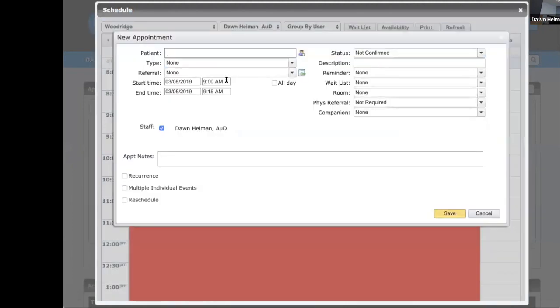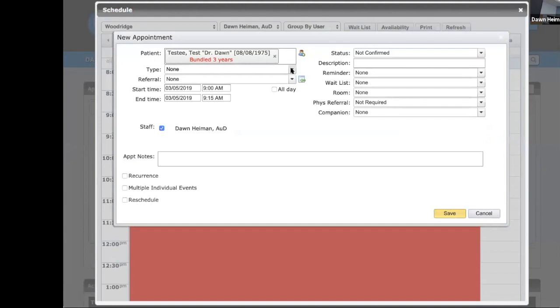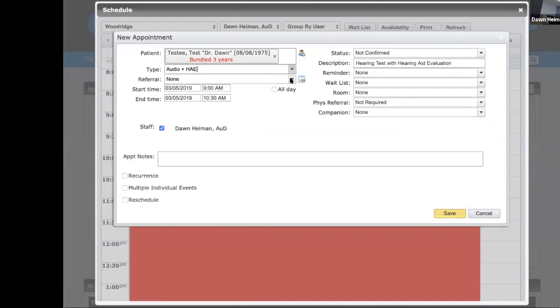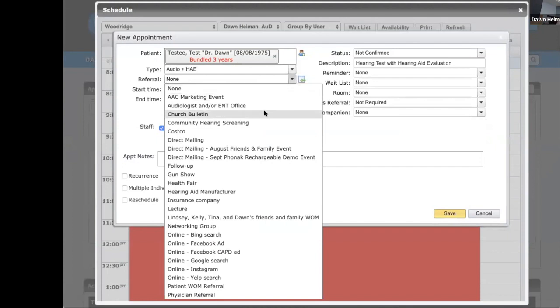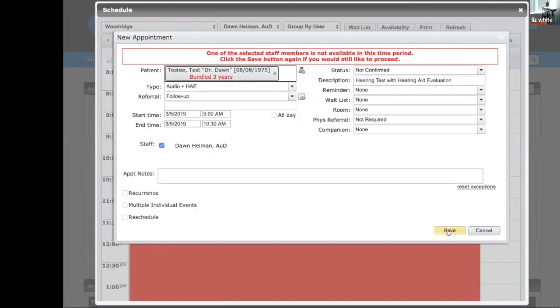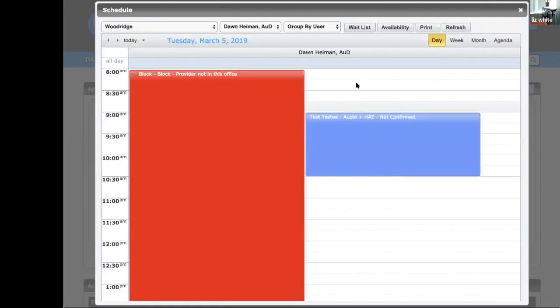Okay, so I'm going to create an appointment for myself. I have my own test person here, and I'm going to do an audio HAE on her. And this is just a follow-up. She found us, right? Okay, so let's hit save.